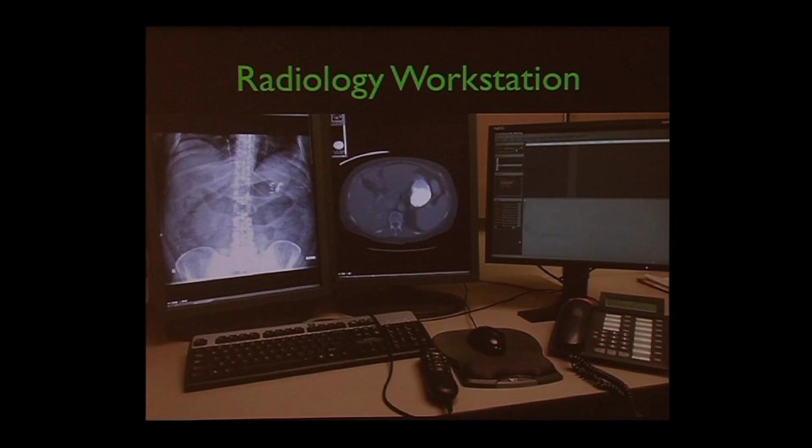A little close-up of an abdominal x-ray, a CT scan, and this screen where I pick up the dictaphone and I see my words going across the screen. I modify, I edit them on the fly because it's not 100% accurate, but it's pretty darn accurate right now. When I first started using these 13 years ago, it was 95% accurate, but boy, the 5% that was not accurate were horrible and embarrassing if you didn't catch the mistakes.